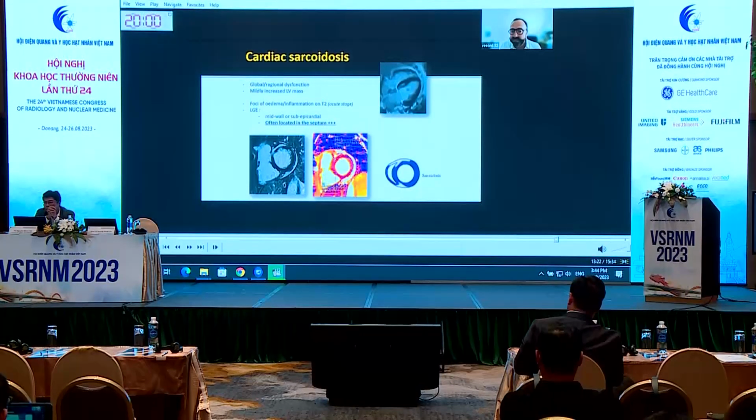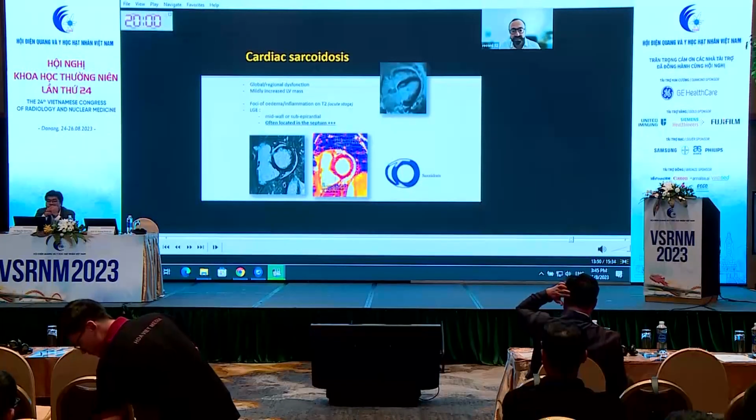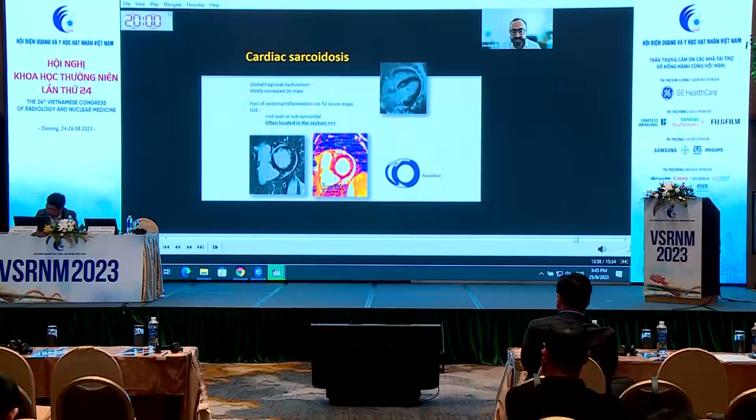Last but not least, cardiac sarcoidosis, which most of the time is suspected when lung and mediastinum disease is already known, but look at the mediastinum on CMR too to depict nodes. CMR is most of the time performed to exclude cardiac localization of the granulomatosis. We must always think about it when we observe subepicardial late gadolinium enhancement in the anterior or the inferior wall with very evocative extension within the septum. And it may be associated with edema at an early stage, once again.